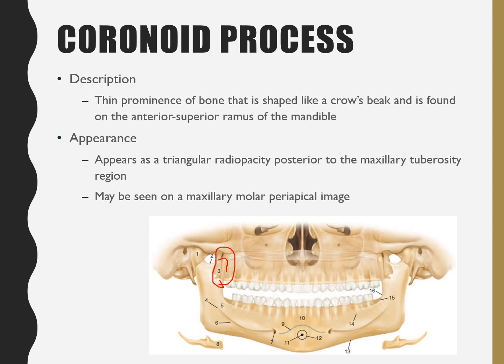And so what you need to do as a hygienist is have them close a little bit, and that will allow the coronoid process to glide back into where it is supposed to be, so that you're able to reach those surfaces of the teeth. So the coronoid process is one of those things that really gets in your way, but it should be pretty easy to remember that it's there, because you're constantly having to deal with that, having them close a little and maybe slide their jaw over to the side so that you're able to access those areas of the teeth.